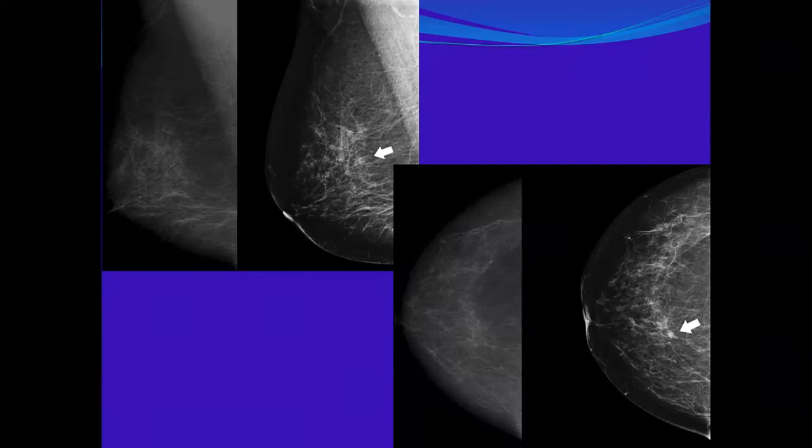It can be benign findings. It can be a cyst. So we have to clarify and make sure what is going on. We cannot say there are no associated features and just follow the patient in 6 months or whatever. No. For developing asymmetry, we have to take it cautiously. Okay? So next.